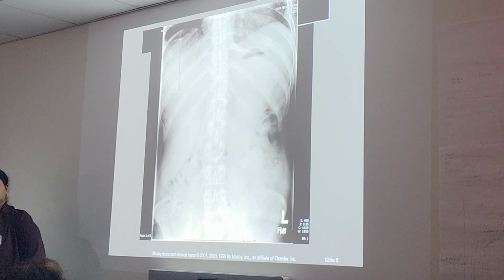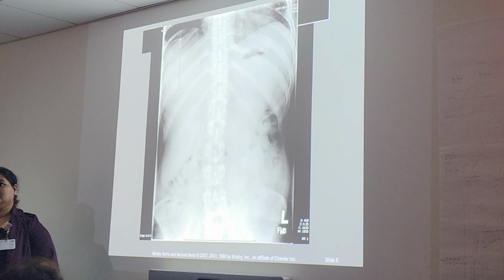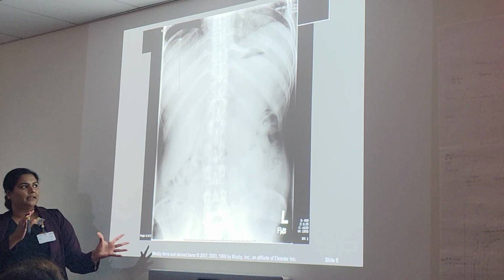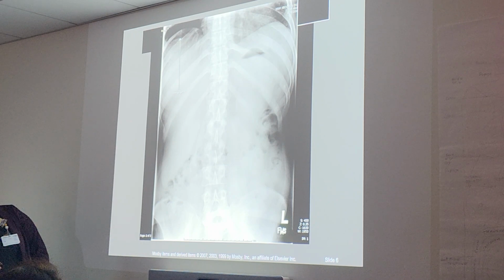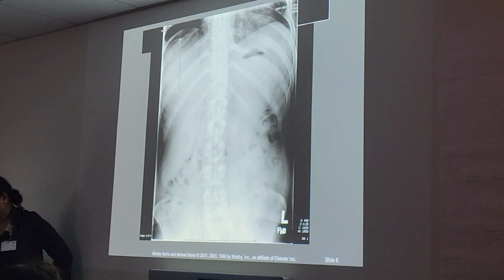Could that also happen from the body not being perfectly aligned? People can move their upper half but forget to bring their lower half. Exactly. If you take a look at their hips, it looks like they're rotated, and also slightly tilted. You check the tilt by the level of their iliac crest. The right one looks like it's a little bit lower.